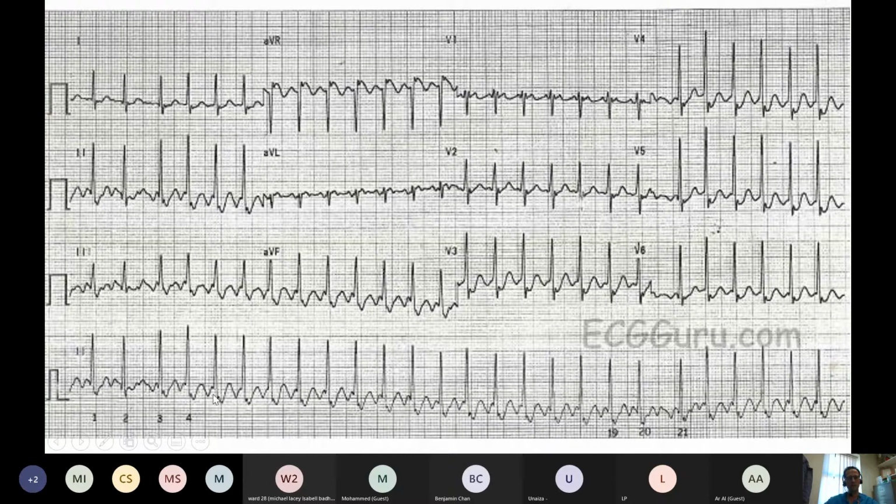And can you think about if you turn this into a saw, do you think you could chop down a tree with it? I mean, I think this looks pretty much as good as one of my saws. I've got quite a few of them. So this sawtooth pattern is what points you towards it being atrial flutter.